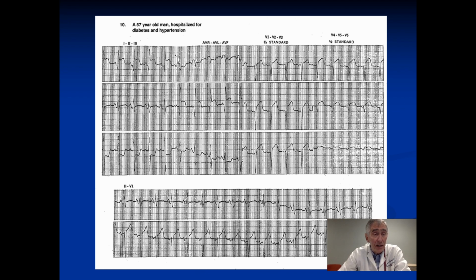So now we're going to look. We have a sinus tachycardia. You see the P wave that's upright in 1, 2, and negative in AVR. We actually look at the axis: it's positive in 1, positive in 2, so it's a normal axis. Then we can look at the intervals, the PR, the QRS looks normal, the QT we're not certain, but it looks like it's about half, and at a fast heart rate we're not too worried about that.